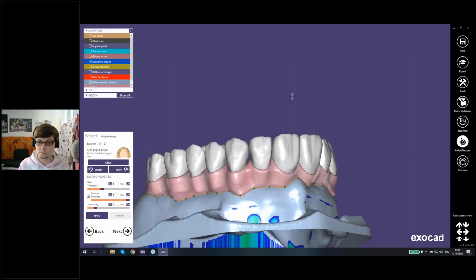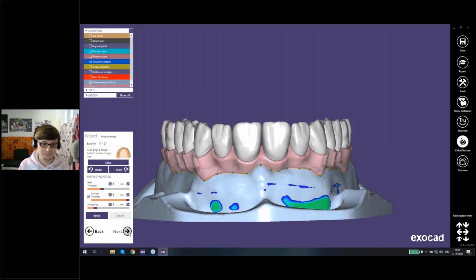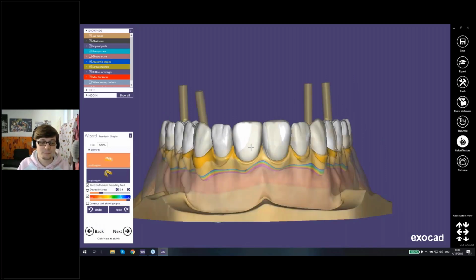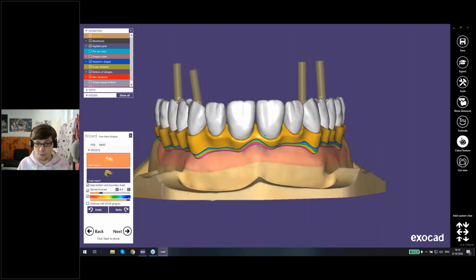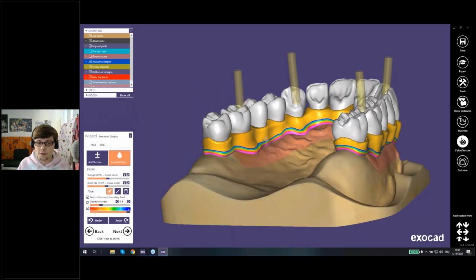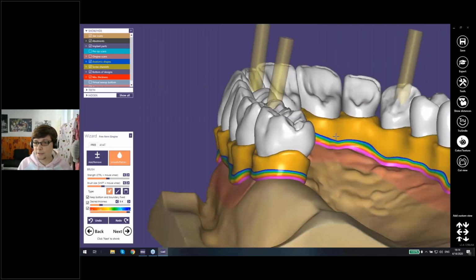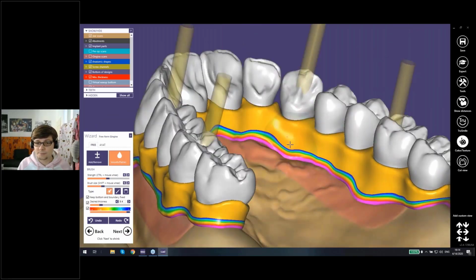As you can see, fairly simple, straightforward design. I'm pretty happy with that. So I'm going to the next step. And now I can freeform this whole thing. There's areas where I say, I want this to be a little bit smoother. For instance, I have my normal freeform tools and can smooth everything, especially here on the palate.